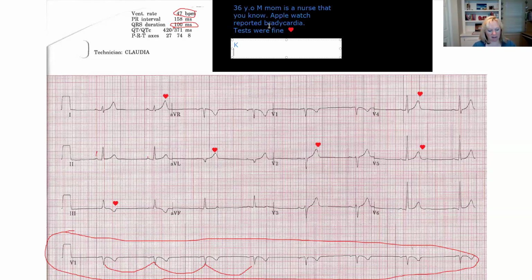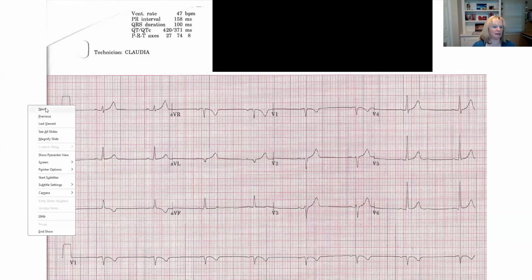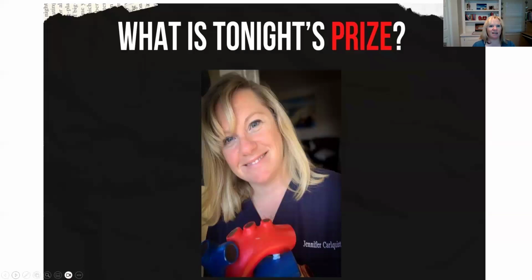The next thing that I really wanted was the stress test, but it was normal. And I wanted an echo because I had an inverted T wave. Echo was normal. And at the end of the day, these T waves, I could never explain them, but he was fine. So always be suspicious until proven otherwise, and always be worried about a heart rate of 47 unless they have no symptoms, they're not on any rate limiting agents, and they're athletic, which is the case of him. So it's fun to put this into practice. So sinus Brady, you guys got it.